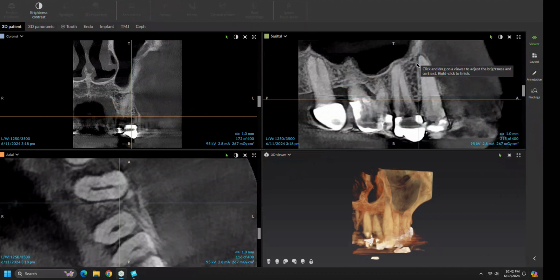This is definitely not what's causing the class 3 mobility, in great part because the bone around it everywhere else looks good, with the exception of the deep pocket. So this is just evidence of what led to the problem, not the problem itself.